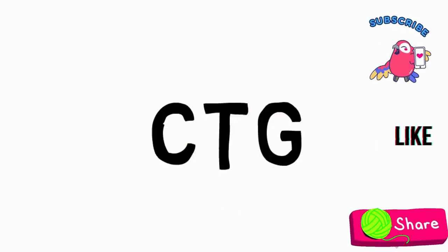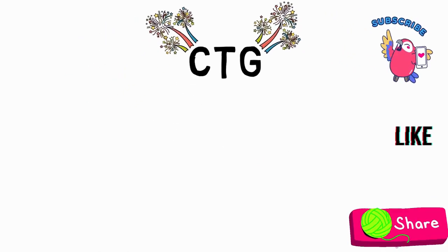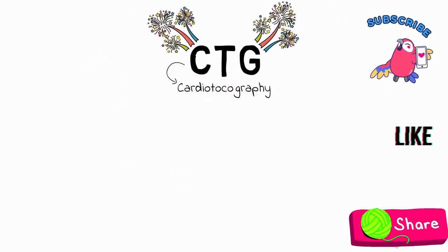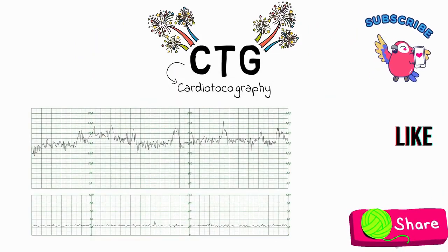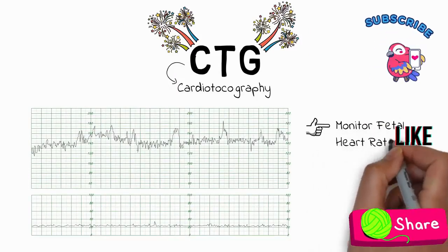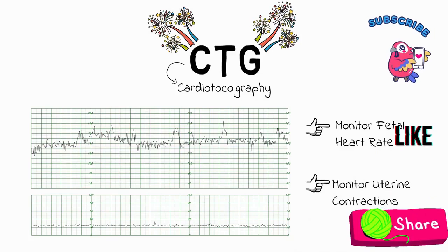CTG. So finally I'm creating this highly requested video on CTGs. First of all, CTG stands for cardiotocography. No, this is not an ECG, but it's a CTG, and it's used during pregnancy to monitor the fetal heart rate and monitor uterine contractions. It is most commonly used in the third trimester and can detect fetal distress.